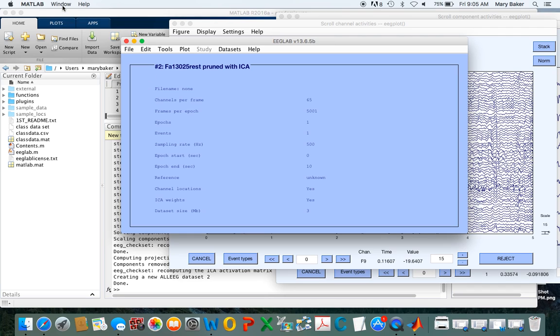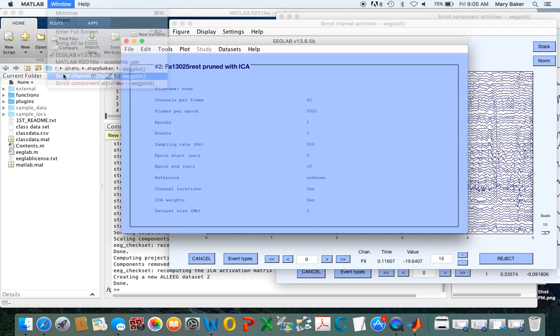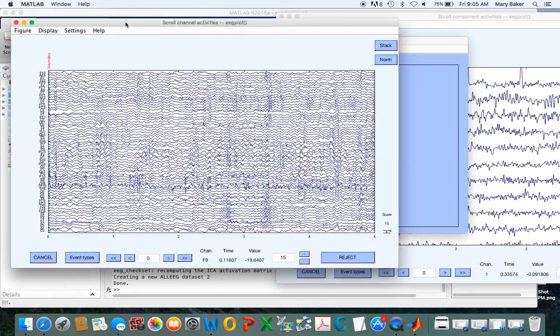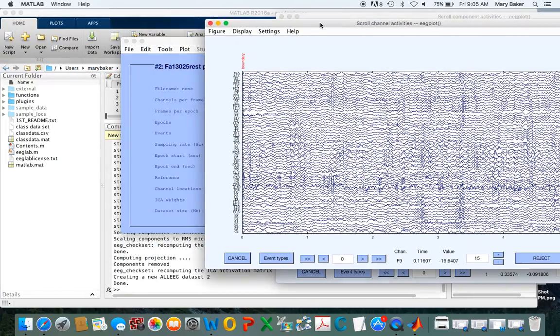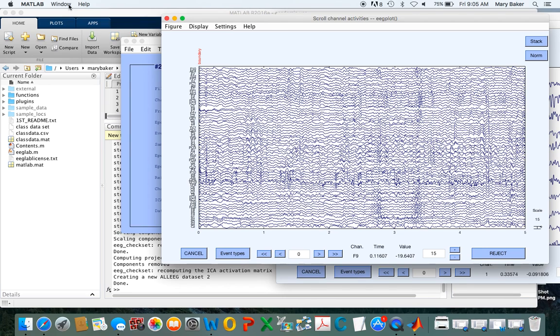So let me come back and see if I still have, yes, I should still have the original plot somewhere. Let me see.